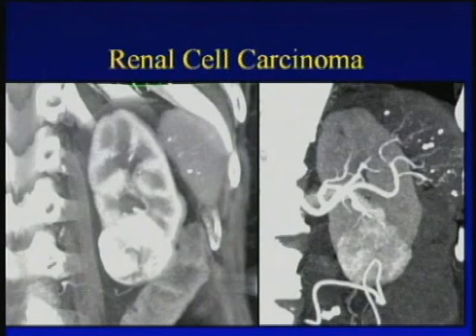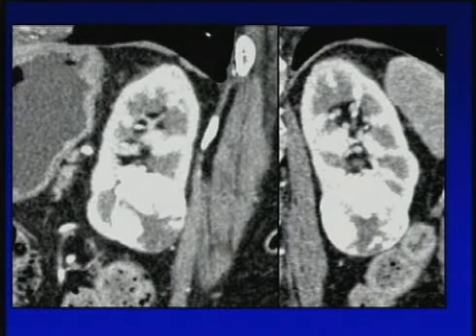In terms of lesion detection, comments about cortical medullary phase not being ideal typically are not really true. Most renal cells, 85% we commented, are hypervascular, and here is the lesion again on volume and MIP imaging. Here it is on a coronal display. One of the things to recognize, of course, are some of the pitfalls in looking at smaller lesions, particularly related to the fact that it's an axial display rather than a 3D display. And I think even from the multiplanars through the 3D, the ability to visualize makes it much easier.